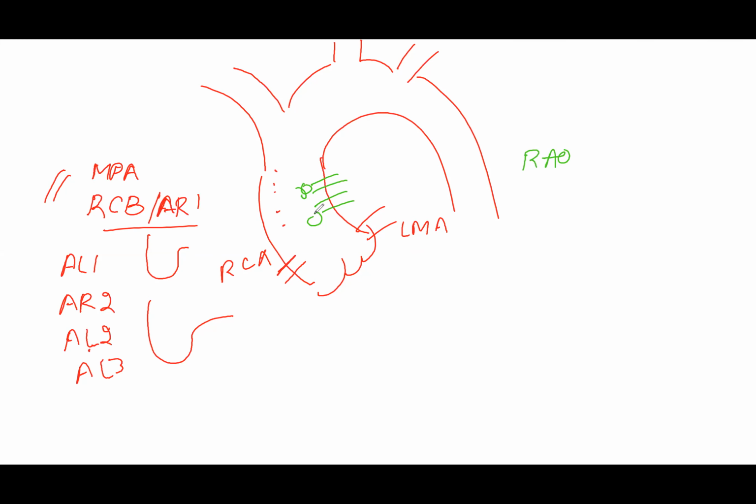So you can see them coming out of this side, and you can just slowly go up. Usually there's a left main coming here, and then you use the left main and go up on the same line, and you will get the LAD. And then the OM, or circumflex graft, is just right above it or just next to it.